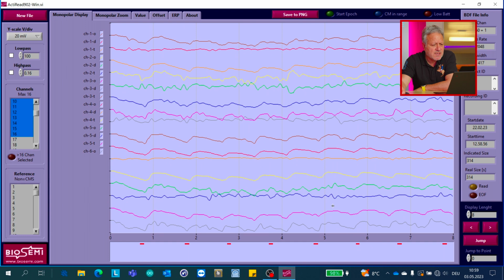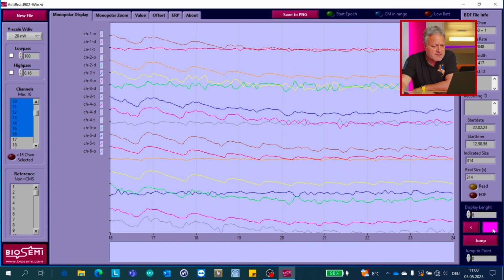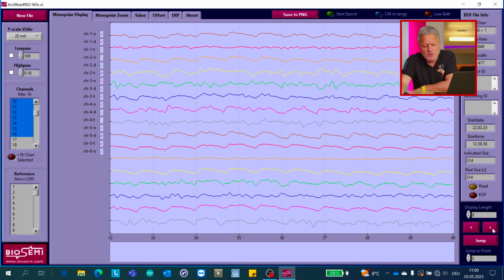And here we can see our oximetry that we've recorded from Joanna during the Jenga. So we can move forward, we can see some things. Now mind you, the file may not be so beautifully nice as it would be recorded otherwise. And the reason for this is because NIRS data is not prone to any electrical artifacts.